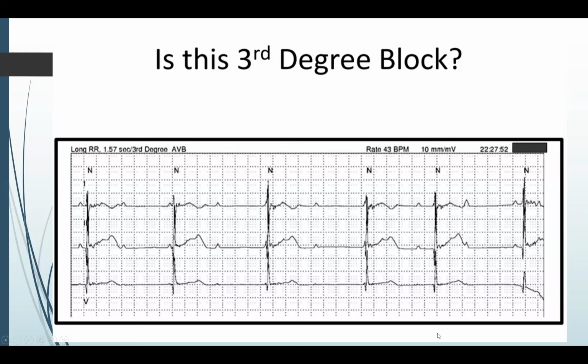This beat here is early relative to all the other QRSs. And obviously, as you said, a longer strip would make this more obvious, but the fact that there is a QRS coming in earlier and following a P wave, presumably with a very long PR interval. The other interesting clue, and it's hard to say in 3 leads, is a suggestion that maybe this QRS is different than this QRS. I don't know if I would hang my hat on that. It's kind of similar, but it would be interesting to see a 12 lead of this phenomenon.